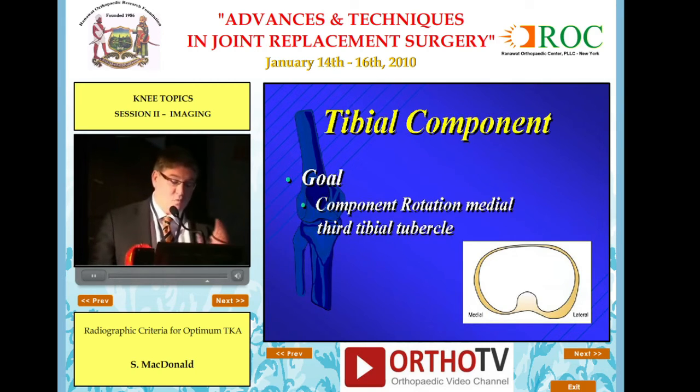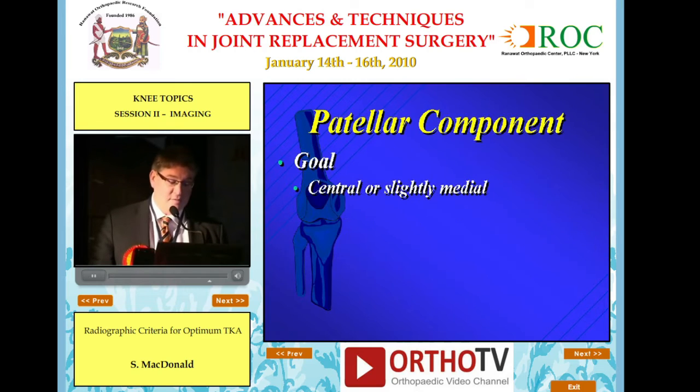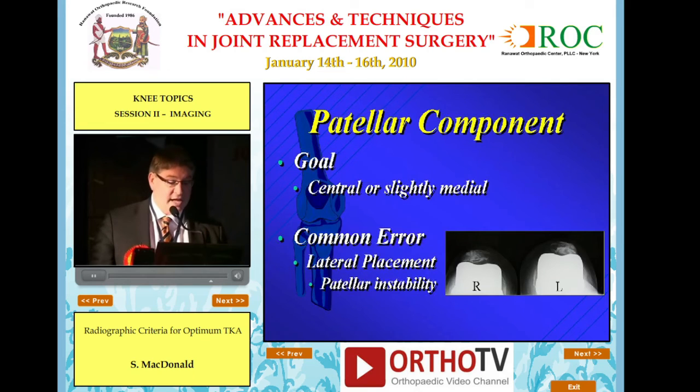Component orientation, rotationally, should be at the medial third of the tibial tubercle, and if you get that wrong, that leads to patellar maltracking and also potentially patellar instability. And lastly is the patellar component. The goal is to have it central or slightly medial. A common error is to place it too far laterally, which can lead to patellar instability.